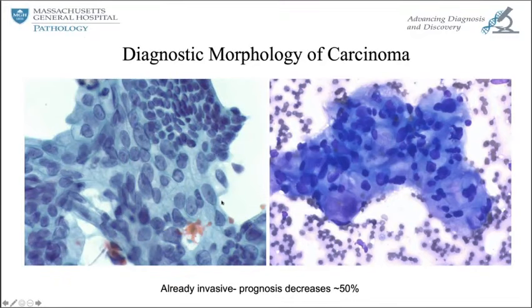Okay, so when you have epithelium that looks like this, where you have the drunken honeycomb, the lacy cytoplasm, the enormous nuclei, just this whole picture of adenocarcinoma. It looks like adenocarcinoma. You're not talking about high-grade dysplasia, scattered cells in the background of mucinous fluid. They look malignant. Then call it adenocarcinoma. Okay. And generally, I would say that by and large, these do correlate with cysts that have a solid component.